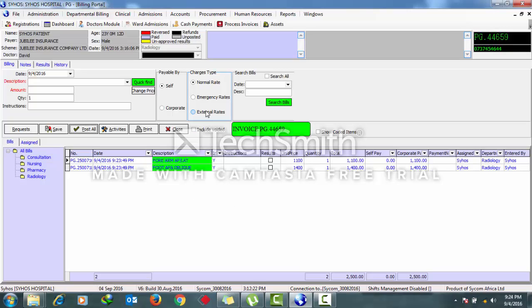For a patient whose payment is expected immediately, the system will tell you, please request for the patient to make payment. So the system does not expect you to continue doing the service before the payment is done. So if I have a cash patient, I'll have to have the payment done first. Sometimes the patient can just come in, for example like a walk-in, or maybe the patient was booked by the receptionist, then sent to your department for the service.